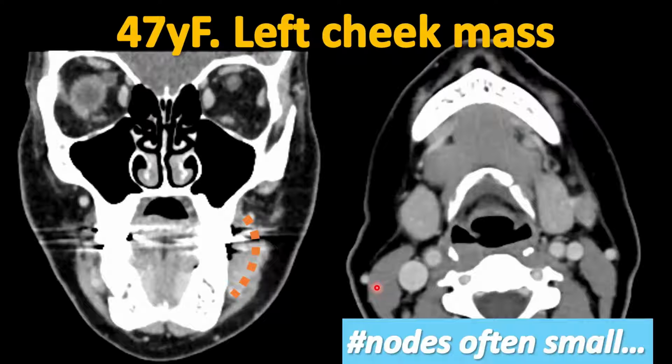Now I'm going down a little lower because I want to show you something in this patient. This was a ridiculously small ipsilateral node, which I couldn't possibly have called positive myself on imaging. And this node immediately behind it, lateral to that submandibular gland in level 1B, it's still small. It's probably not quite a centimeter, but it is a little irregular. We call this concerning because we have a high degree of suspicion with these tumors, and these nodes are frequently taken as part of the surgical resection of the primary tumor because of the high tendency for metastasis.